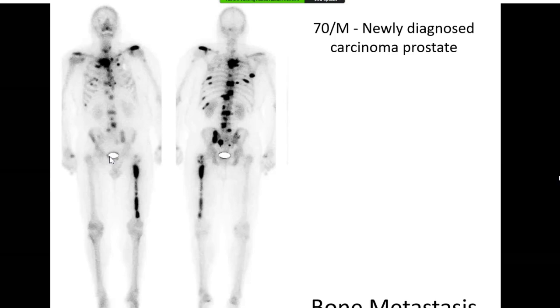The reason is that if the patient has not been able to empty the urinary bladder, a lot of counts can come from it, and that can reduce the count from the bone, because most of these studies would be done on either a fixed time or fixed counts basis, especially fixed counts, and most of the counts can come from a distended urinary bladder.